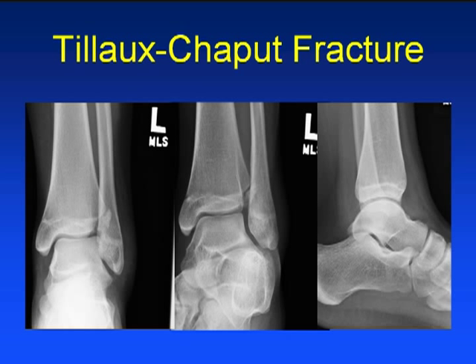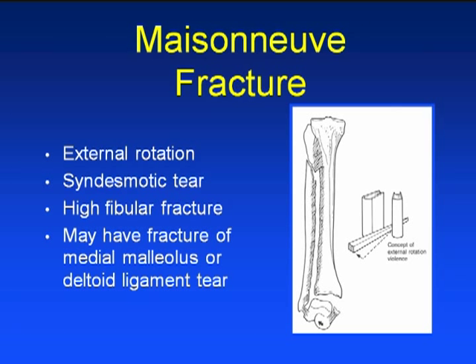And here is one, now made obvious because this is a follow-up injury, and you now see the corticated fragment. We missed this the first time through, but there is an avulsion of the anterior lateral tibial tubercle in an adolescent, and we went forward that way. Now, Maisonneuve fractures, you've heard about these.